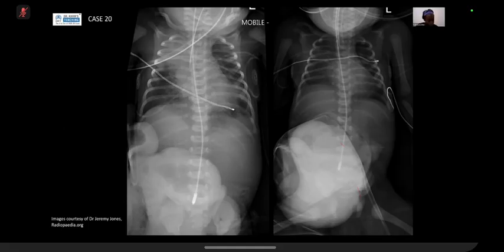Yeah. So other than that, I think there's a sign of pneumoperitoneum because I think there is a football sign in the abdomen. Oh, okay. Describe where you're seeing it for me. Because I think there's a lucency overlying the liver, and the left lumbar region. So it shows a football sign. Okay. Other findings.